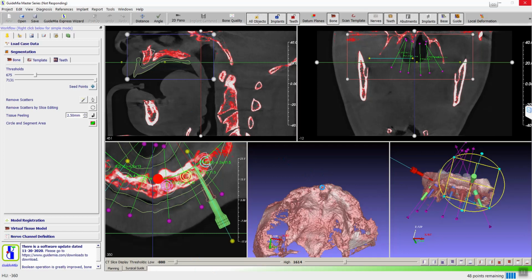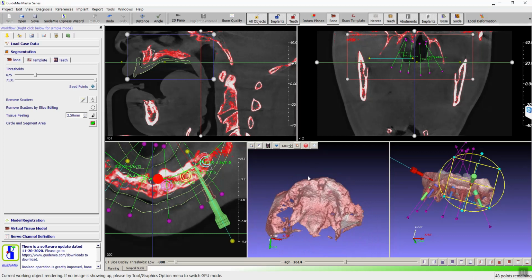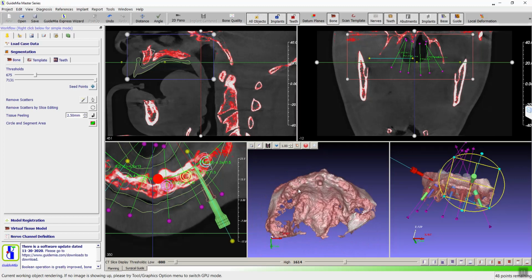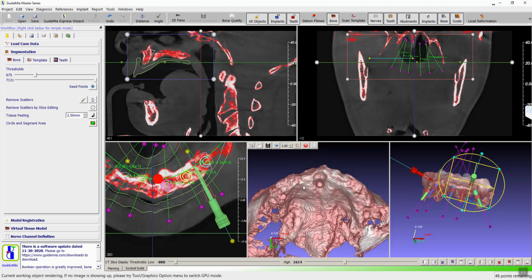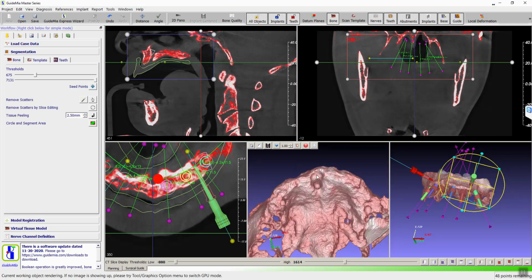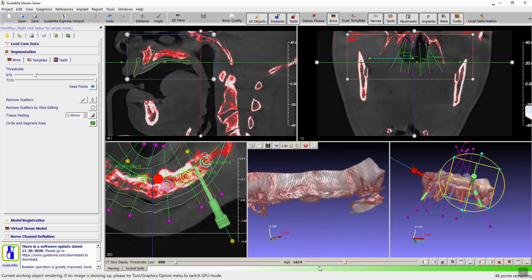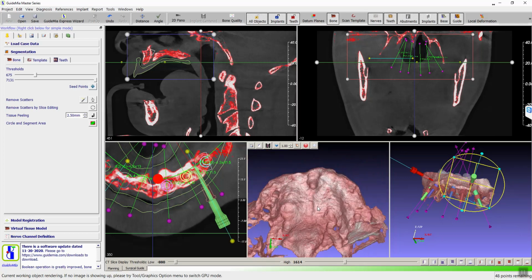So did you get that? It's going to be bone-borne in the front and tissue-borne in the back. Tissue-borne. Yes. Oh, I like that. So we have quite a few cases with some doctors, and we got all kinds of work wrong. And once I did actually create some guides with other doctors, but I think now we need to build this into the workflow. Now this is a bone model we processed, right? Processed. Now here is what is going to be different from what we had before.